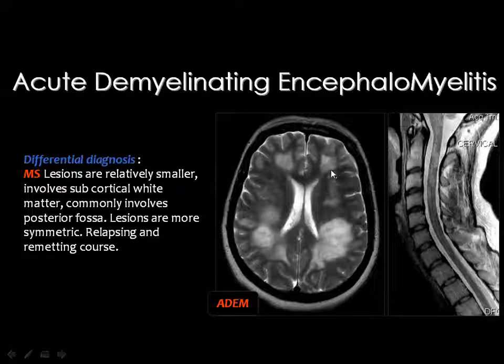This lesion, in many cases, simulates multiple sclerosis, and being located in the white matter, showing most of the criteria of MS. But you know that MS is a multiphasic disease, but this acute demyelinating encephalomyelitis is a well-known monophasic disease.